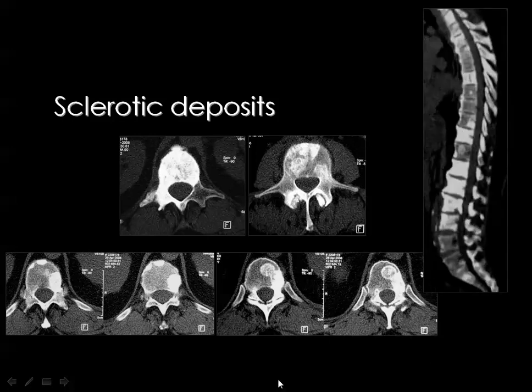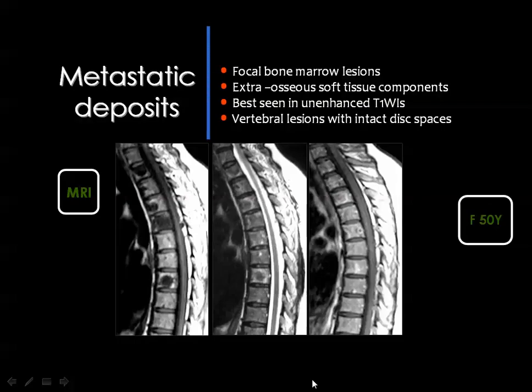can see here. And whenever you have the possibility to reconstruct the images in a sagittal or coronal way, this is very helpful, especially in the follow-up of the lesions, because in a single image you can know the level of the metastatic lesions, and you can compare this image with the recent image to see the response to therapy.